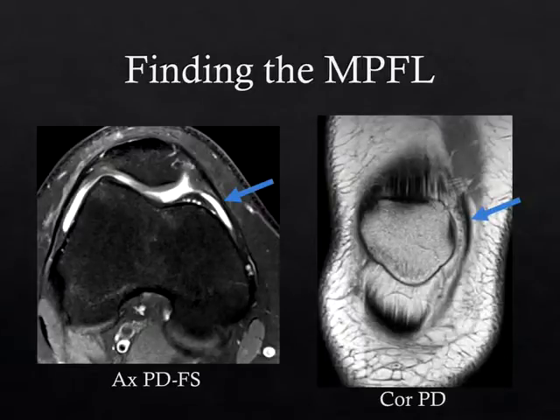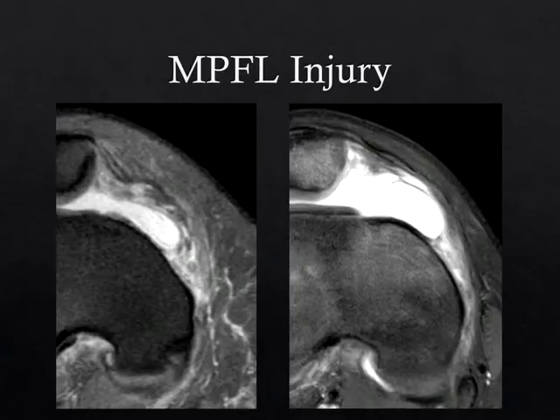It blends in with the medial patellar retinaculum, which is technically considered the inferior ligamentous attachments of the medial patella, but they're all one structure, so it's difficult to sort them out. We don't make the distinction. I just tend to call it all the MPFL.